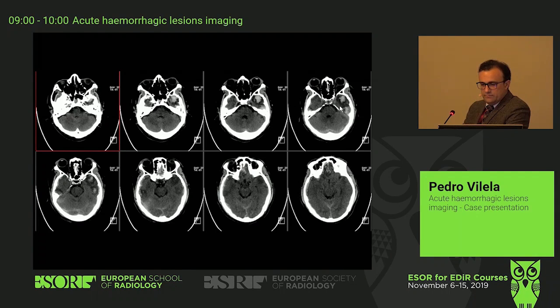That's intracranial bleeding in the acute stage, and around it hypodense edema of the brain, so it is a haemorrhagic contusion of the brain tissue.